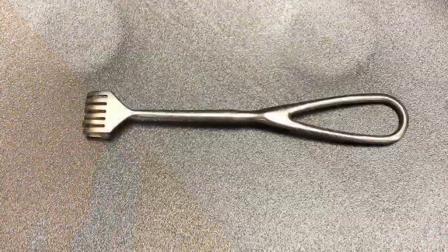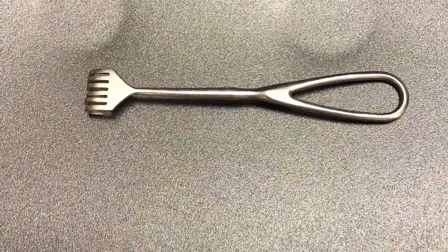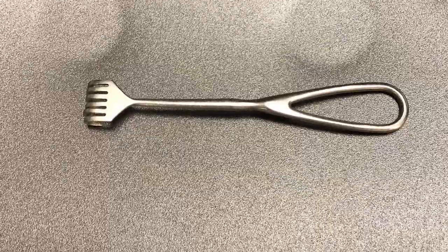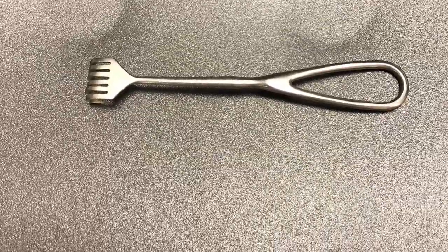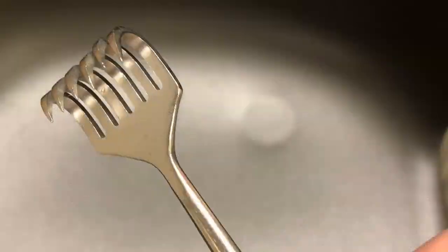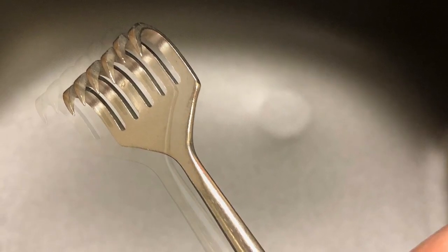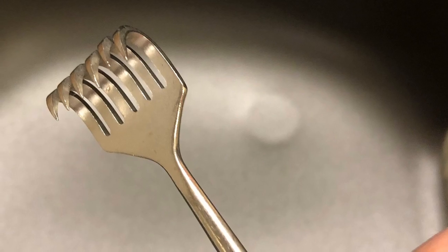The sharp rake retractor. This is a handheld retractor that is used in small bone or joint surgeries or superficial depth surgeries that grab the skin edges for allowing the retractor to be pulled up, like in a grasping manner for exposure.